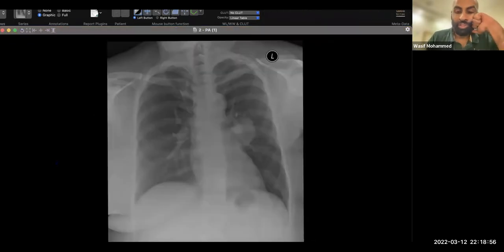So, pertinent negatives are very important in coming to a diagnosis, but more importantly in showing the examiner that you've considered a differential. So, simple terminology: a well-defined opacity is seen projected over the left hilum. It has clean borders. There's no mediastinal lymphadenopathy. The left heart border is preserved. You can see the hilum overlay sign through the mass. Give the inference. That means this is not a hilar mass lesion.